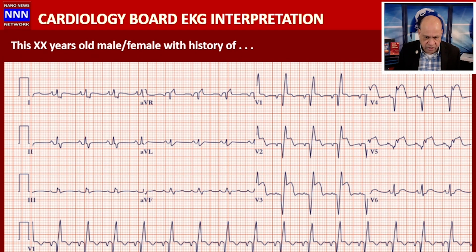So this is a case of an acute myocardial infarction. Since this patient has already developed Q waves, this myocardial infarction is greater than 6 to 8 hours old. And of course, it goes all the way up to the lateral wall, V4, V5. There are a lot of things in this electrocardiogram, but remember, we are not just interpreting the ST-T changes, we're interpreting the entire answer key sheet.